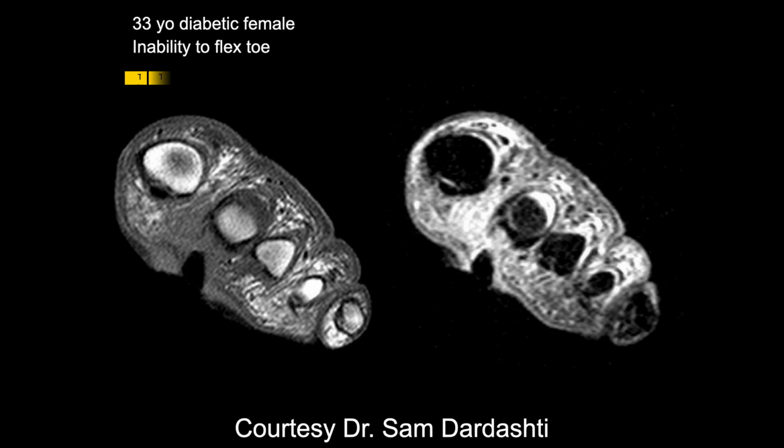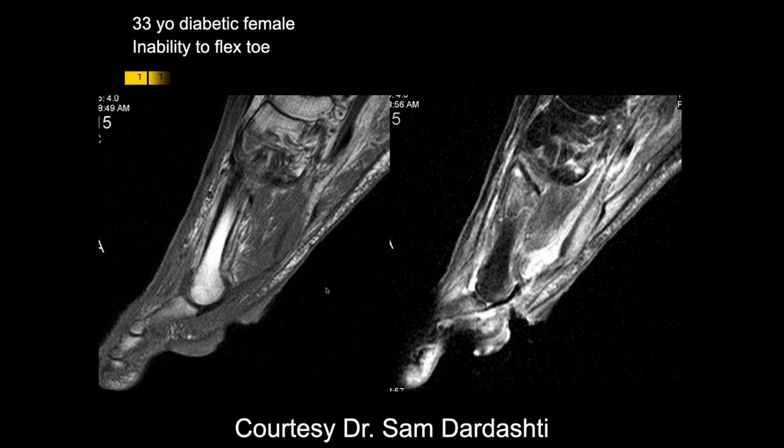Here we're looking at the plantar aspect. It looks like there might be a defect within the soft tissues and significant soft tissue edema along the plantar aspect of the foot. And I'd be worried about an infection here. And this patient's diabetic, so concerning for cellulitis. And you can see the defect, and you can see the edema extending into the muscle, actually, the first MTP joint even, and along the plantar plate as well.